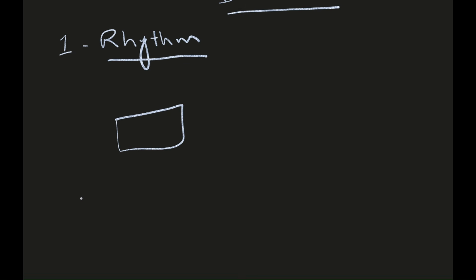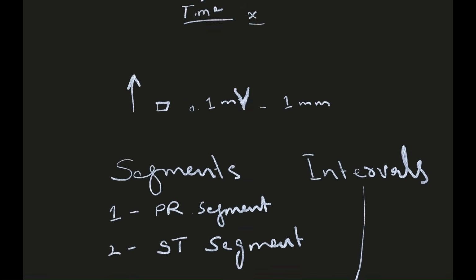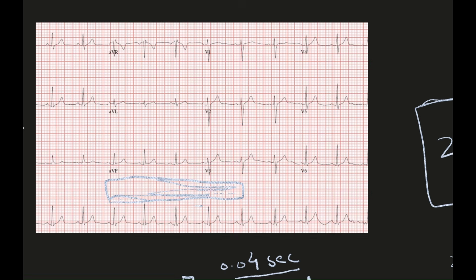Take a piece of any paper and put it over the ECG paper.